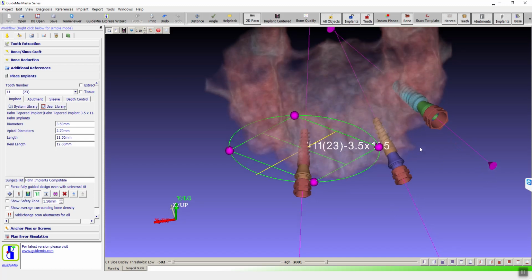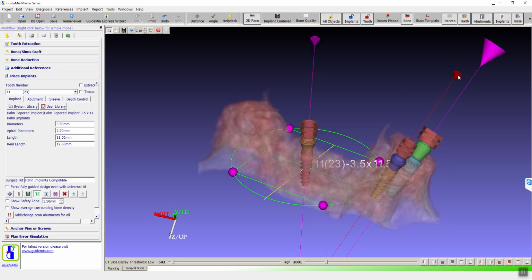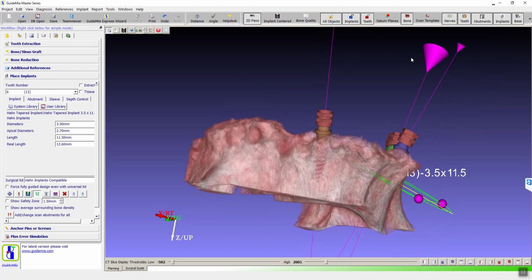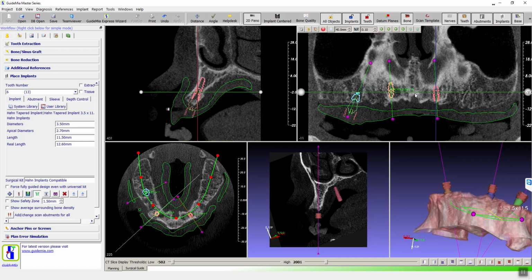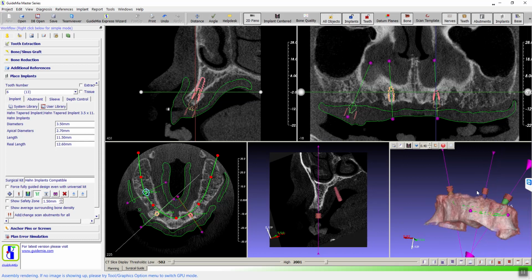Considering later on we probably want to do a bone reduction, then we can push the implant lower by just, for example, doing that. We can push it lower. Of course, we can always adjust the translucency to see the relationship between them, or we go back to the 2D screen to verify their relationships. So that's how we place an implant in general.